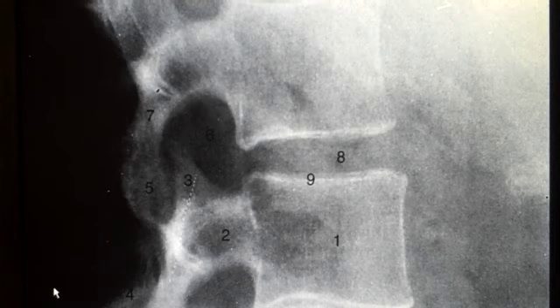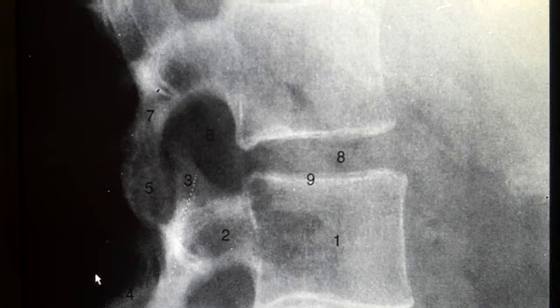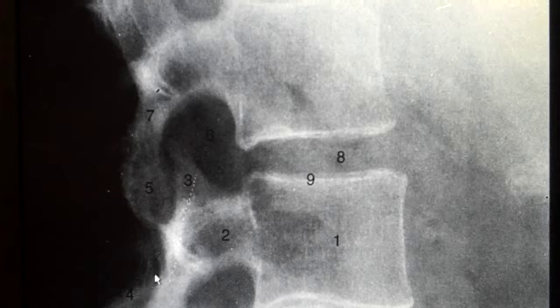But spinuses are huge, but spinuses also are very flat, very thin, so they don't have a lot of density. And so that's why you don't really see an image back here for the spinous, but the spinous would be right here where the arrow is right now. If you're real up close to the pars, you would really be on the lamina portion of the segment, and so you can almost see that slight image of the spinal laminar junction line right there. The IVF, of course, is this, and again, the pedicle is this. So that is the close-up.